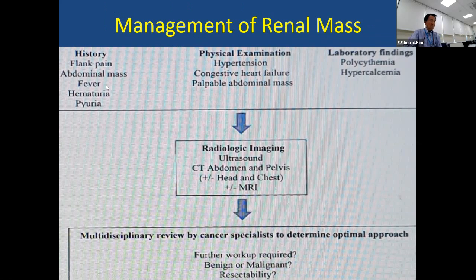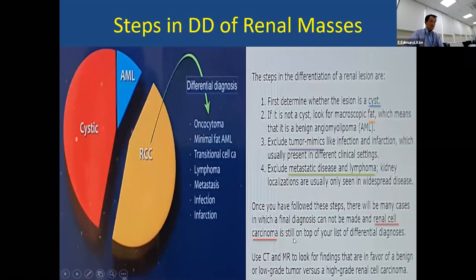So physical exam and all the clinical findings are very similar, but basically depending on ultrasound, CT, or sometimes MR, we make a differential diagnosis. So renal cell is about half. But you have to separate oncocytoma. It's a high density on CT somehow. But transitional cell carcinoma, lymphoma, metastasis, infection, they all look alike. Cystic is easy. The outline is very good.